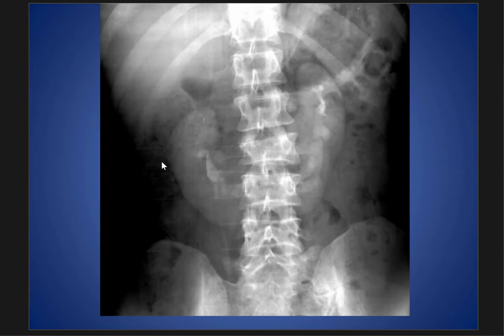And horseshoe kidney, as we see here, can be identified on the IVU, and also in other imaging modalities like CT, MRI, ultrasound, and in nuclear medicine. CT and MRI are the best in demonstrating anatomy and also demonstrating the accessory vasculature and surrounding structures.